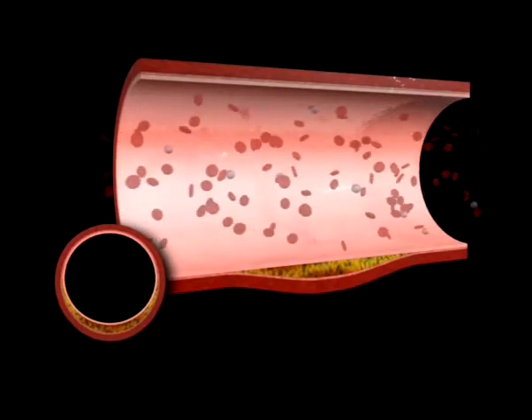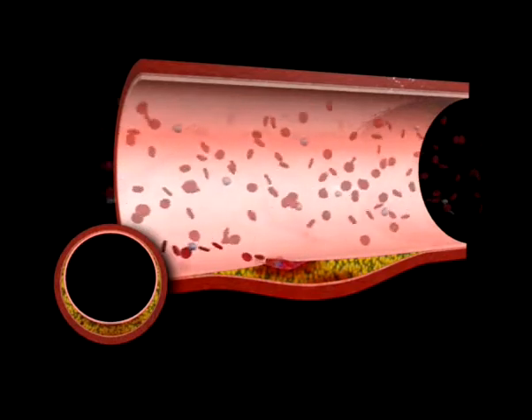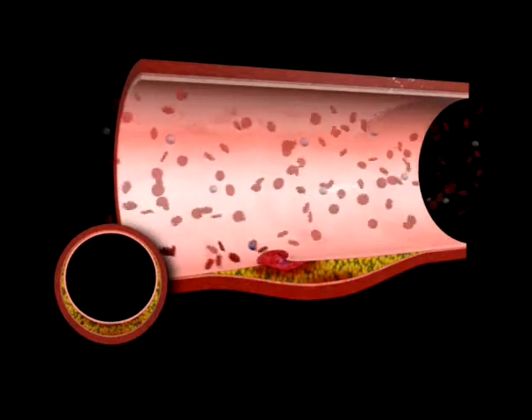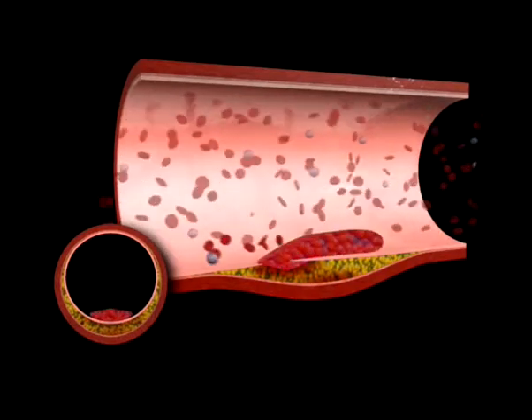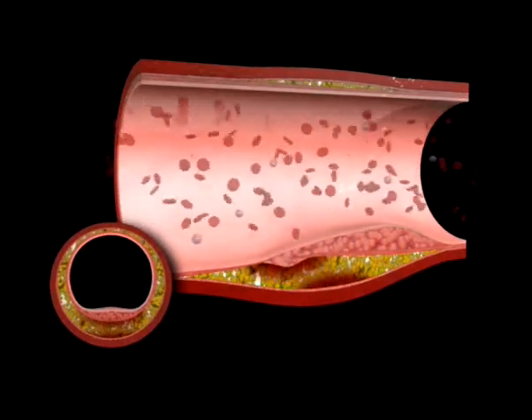It cannot measure the volume of disease that has accumulated in the vessel wall, the extent of remodeling the vessel has endured to accommodate this plaque, or the type and stage of disease that is present throughout the vessel. Multiple views and contrast injections do little to provide added clarity to the diagnosis.